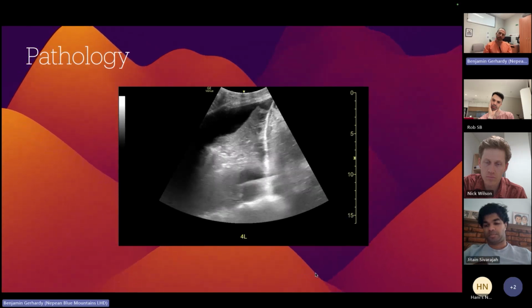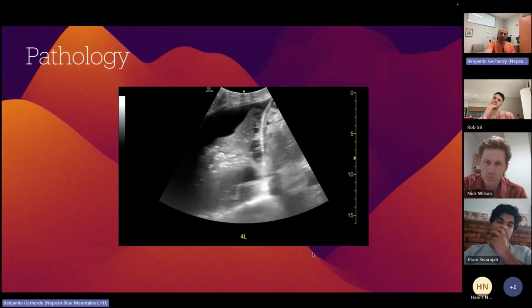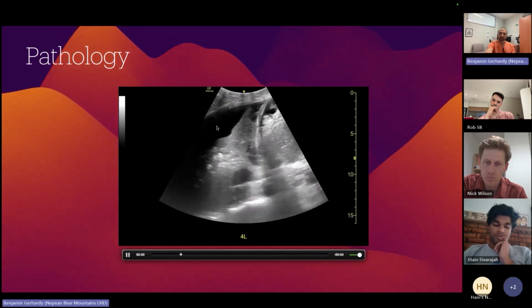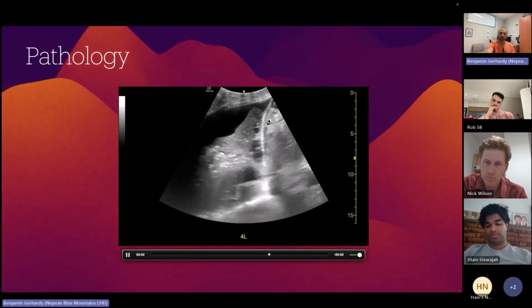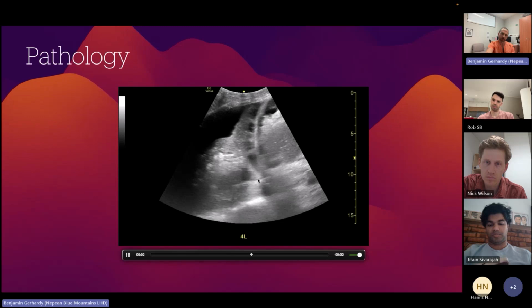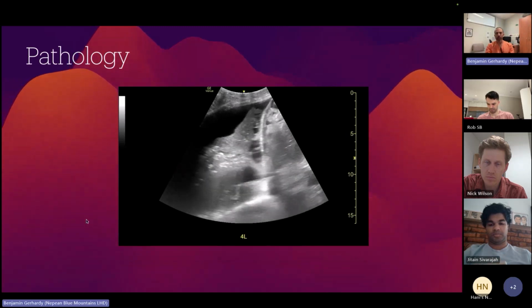And here's another far prettier example, I think. You've got some collapsed lung coming in through here, and infected looking lung coming down through here. Big effusion at the top here, completely raggedy, heavily septated lung all through here, some ascites through here, with muck in that as well. This is the sort of stuff you'll see. You go hunting for it, you find it.